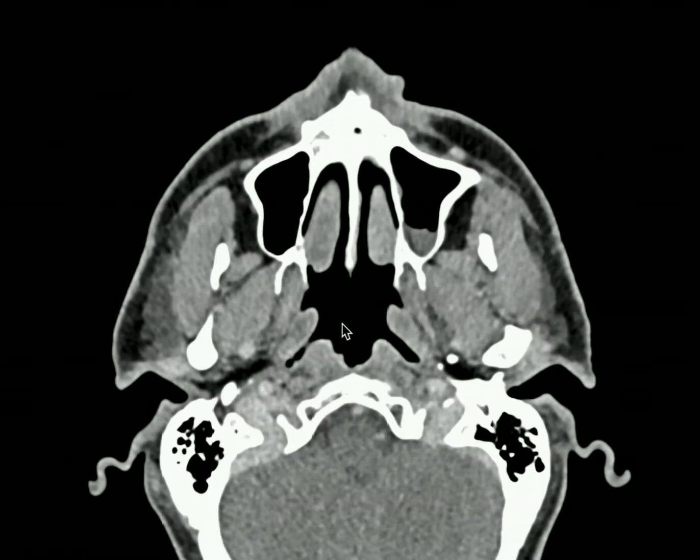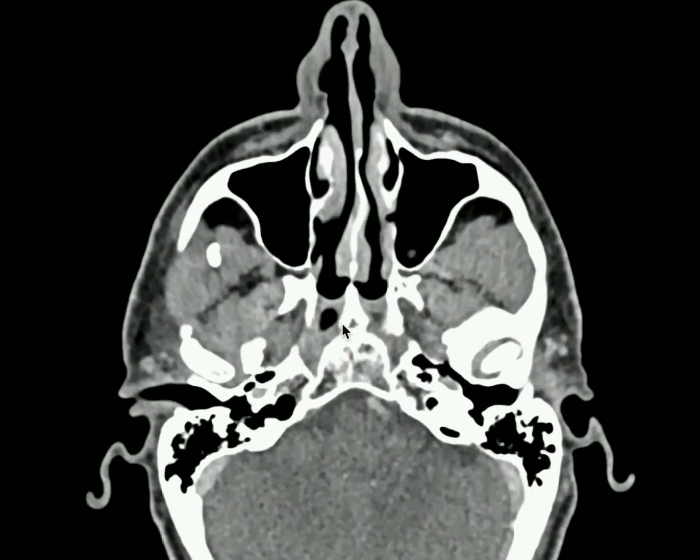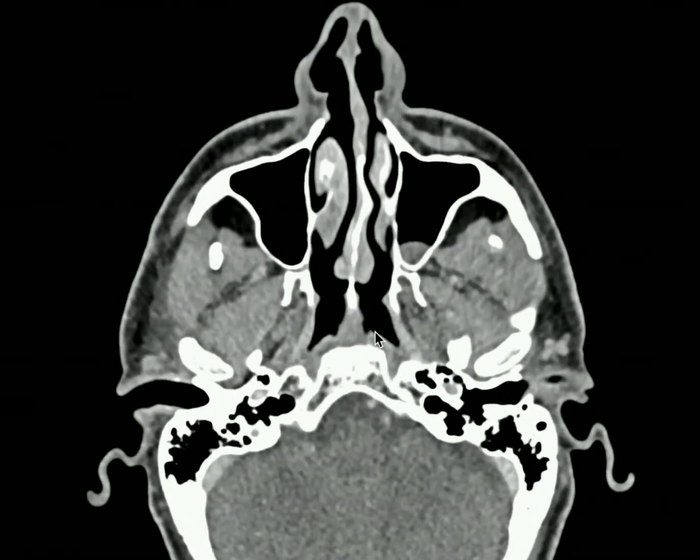Also on the roof of the nasopharynx, you have the adenoid tonsils. These will be located up here and tend to increase in size until about age 6 and involute by 8 to 10 years of age and almost always by 16 years of age. They can sometimes, however, obstruct the nasal airway, as we'll see in a moment in a radiograph of a 6-year-old boy.